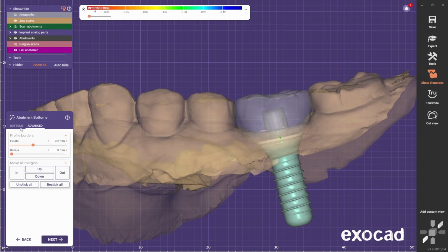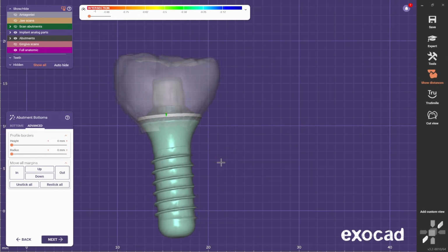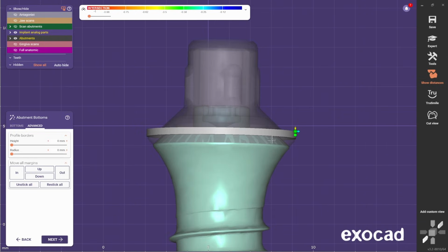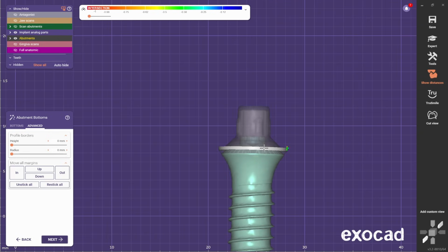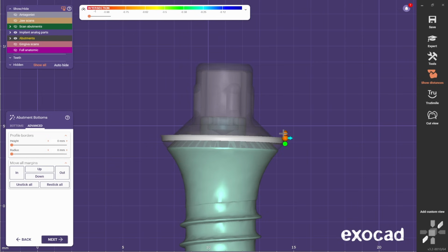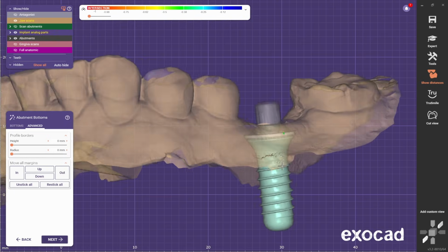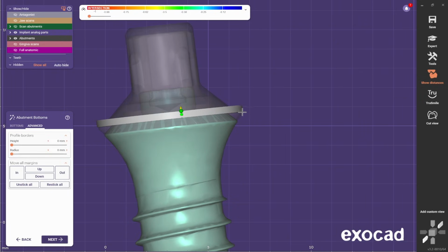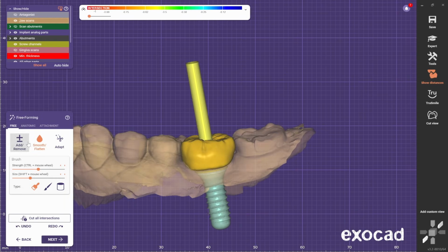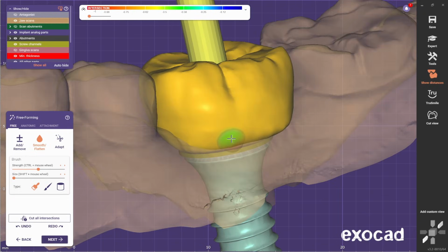And usually I like to go to advanced and bring it all the way down. With this abutment, with this tie base, wide necks, usually it's kind of forced for us to leave like this tiny band all around, because ideally I wanted to bring it all the way down, which is not possible. So probably we need to come back later once I have the crown adapted to make a smoother transition. Otherwise you're gonna have a sharp angle here. So now it's adapted, and we're gonna need to smooth all this area around.